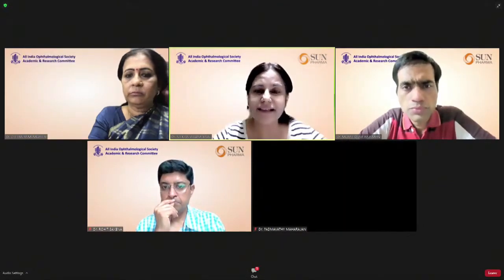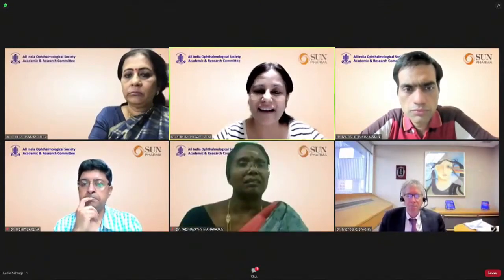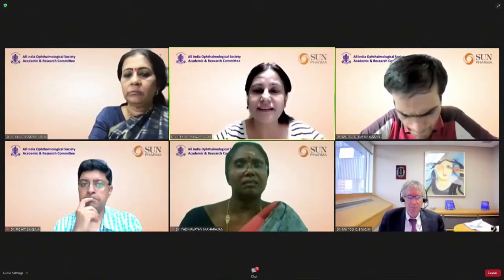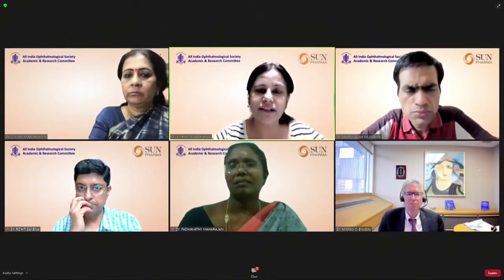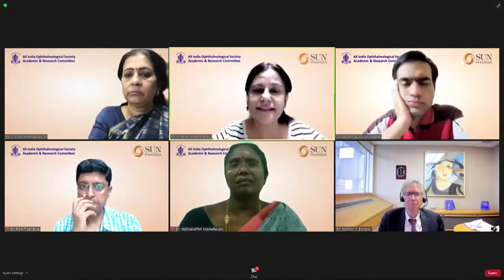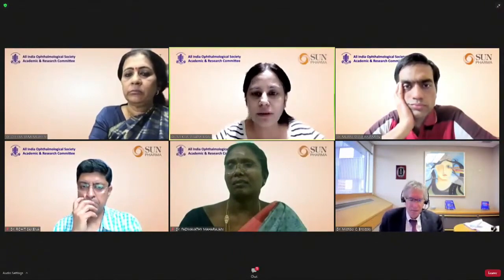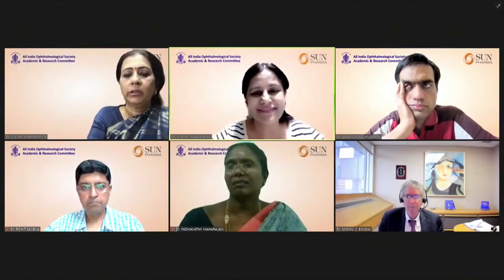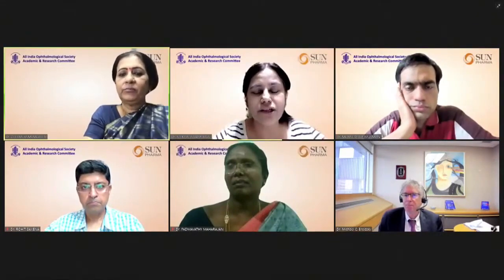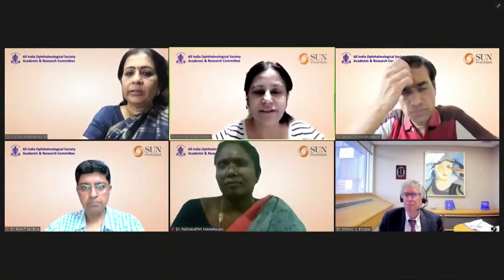RNFL, if it is anterior ischemic optic neuropathy, you will obviously have the RNFL thickening also. But the thinning part of RNFL takes time. So when we are talking about changes in RNFL and GCC, it is the thinning which has any implication, and it occurs sooner in GCC. It's more evident in GCC than in RNFL. I've already shown my patient with pituitary adenoma, where the GCC was affected and RNFL was normal.